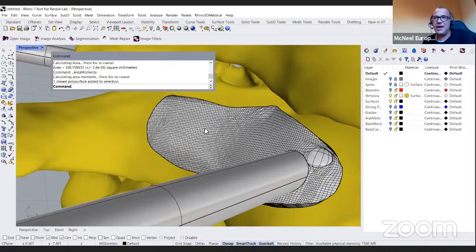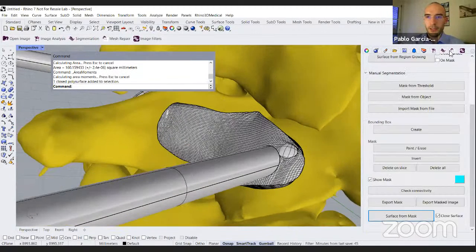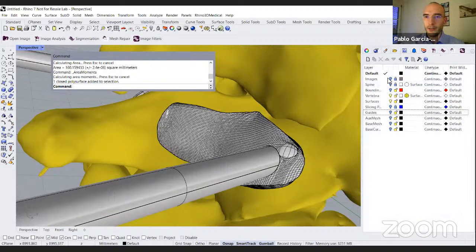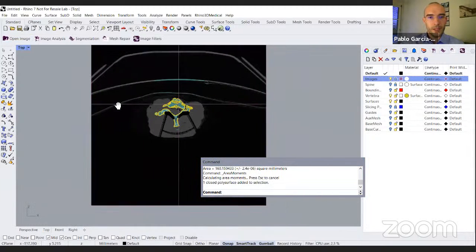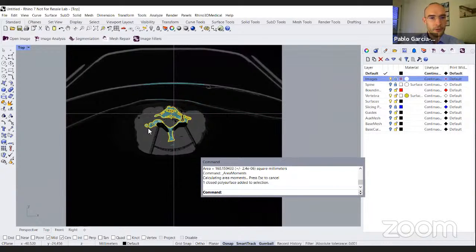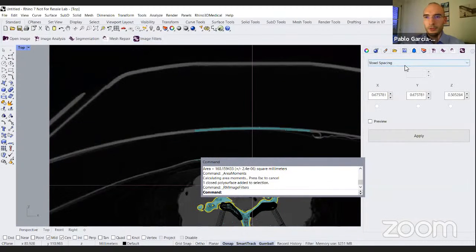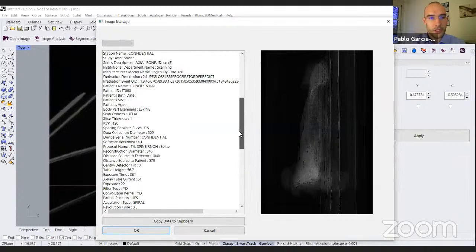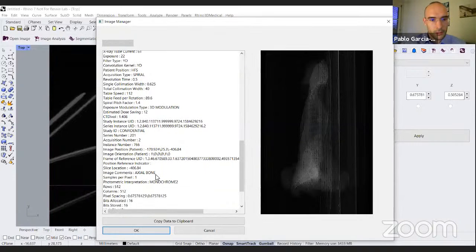El Ansari Yassin asks if we can take dimensions from the scan. Manually, I guess so, right? Let me show you here. First, the DICOM metadata should tell you the dimensions. And then you can call RM image info. That will tell you the voxel spacing.